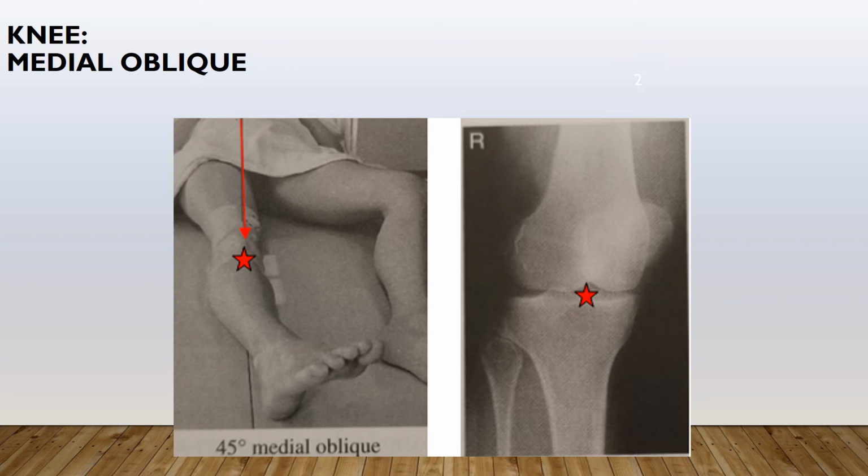Image evaluation, you want to open your proximal tibiofibular joint, with lateral femoral and tibial condyles in profile. You want to have the proximal tibiofibular joint open. The tibial lateral condyles are demonstrated. The head and neck of the fibula and half the patella are seen without superimposition. And the soft tissue and sharp bony margins and trabeculation are clearly demonstrated.